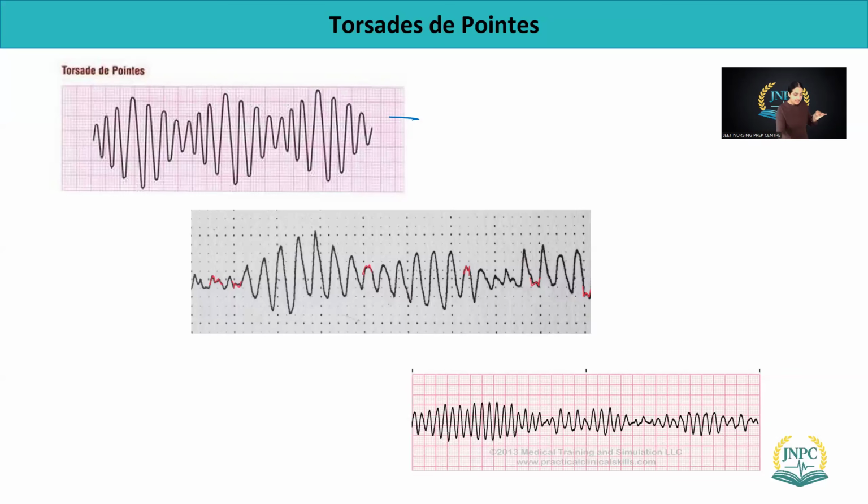You see a special kind of pattern, a kind of curveball, and then it slows down, and then again big lines, and then it slows down. Some people can distinguish it that way, and sometimes it can be seen with lots of M's and W's here, M's and W's. That's another way of saying that this client is having torsades. Torsades and V-fib look kind of the same.